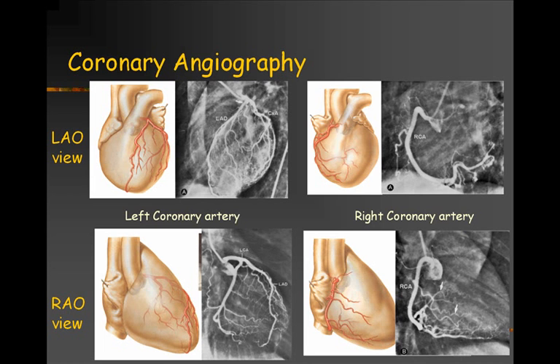Here we have two examples of coronary angiogram in the left coronary artery and another two examples for the right coronary artery. It is again important to correlate radiology with anatomy.